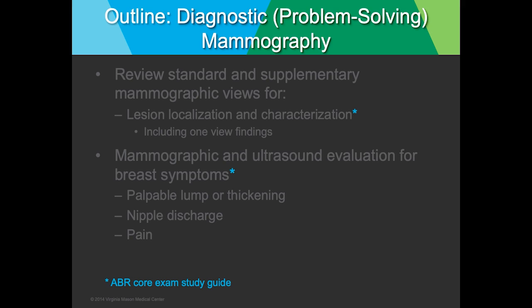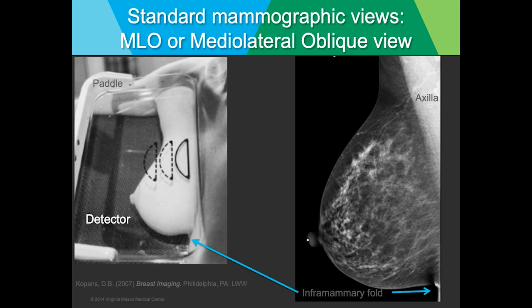Please note that there are separate lectures covering mammographic image interpretation, BI-RADS lexicon, and symptoms in men and pregnant or lactating women. Beginning with the standard mammographic views.